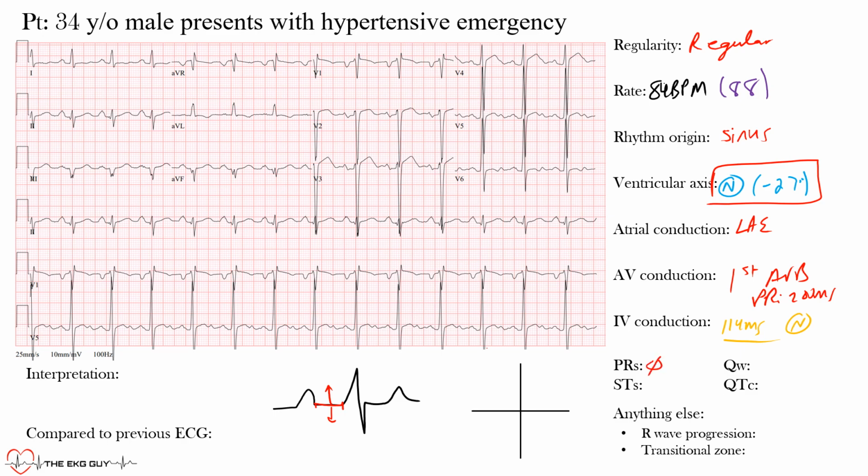All right, and now how about the Q waves? Do you see any abnormal Q waves? Remember, the Q waves are the first negative deflection that we can see of our QRS complexes that precede the R wave. And in this case, you may have some Q waves here, per se, in the inferior leads, and even one starting up there. And these ones might be significant. So we do have some Q waves in leads 3 and AVF.